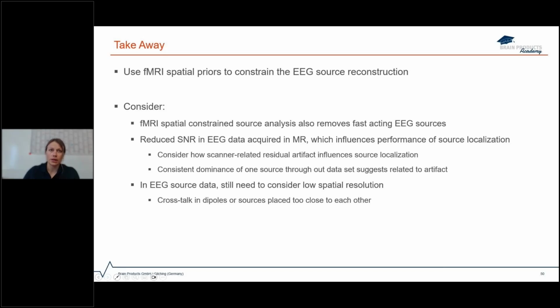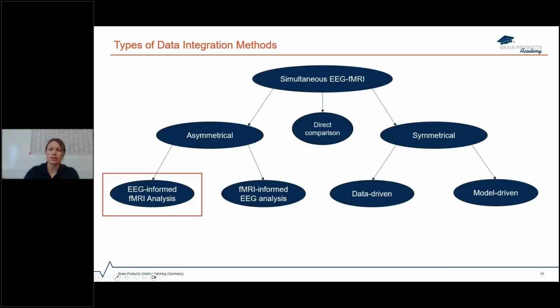Now, we're going to switch gears a bit and use the same data that we have been referring to throughout this webinar, but now we will perform an EEG-informed fMRI analysis on this demo data.